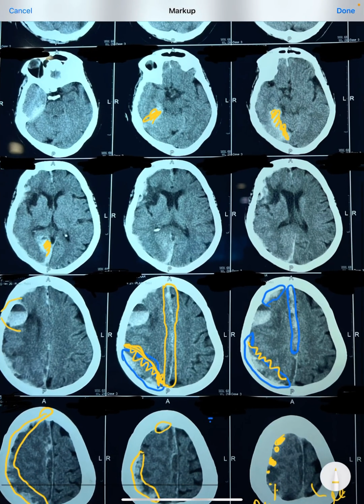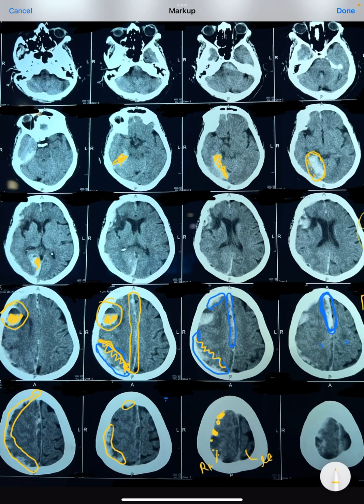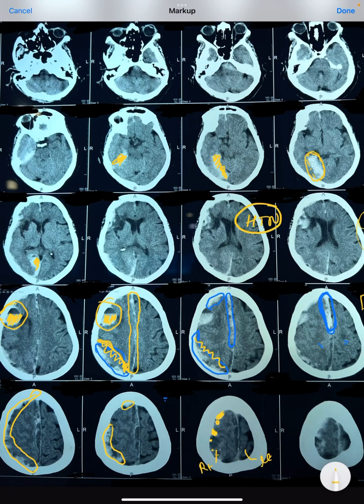Apart from that, we can very nicely see there is accumulated blood. This is dense white, so this is blood. So there is presence of blood out here also. We can have bleeding in the brain in three conditions. One is hypertensive bleed. To remember hypertensive bleed, we can remember the PTPC mnemonic. The most common site is putamen, followed by thalamus, followed by pons, followed by cerebellum. So these are the most common sites of hypertensive bleeds, meaning the bleeding location in a patient who has persistent high blood pressure.